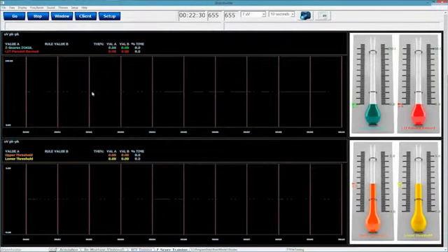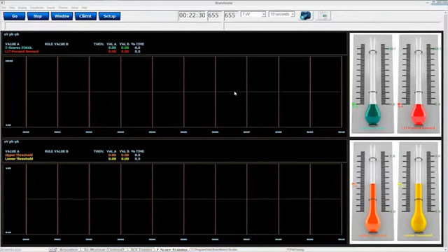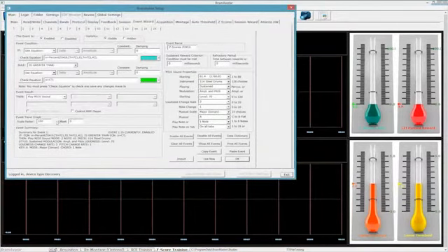And in the BrainAvatar software, we've gone even further, so that you can display it in a thermometer, much like you could a standard amplitude or a standard filtered waveform. In order to view what you're going to view, you have to say what size I'm going to view on. That is where our event trend graph comes in. There are two factors to it. Our scale factor: how big do we want it? What does the number mean? Well, it all depends on what you're looking at, so it does change values.